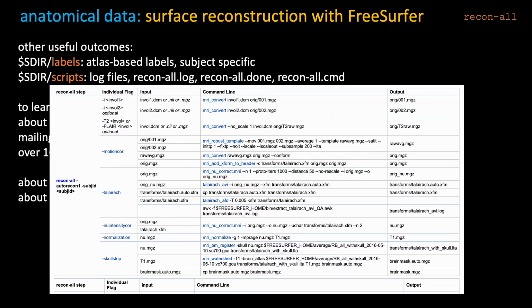So normally you would run recon-all with the all flag, and that is going to run the whole set of the commands. But if you want to run a specific part because either you're debugging something or you just generated a different segmentation, like we'll see in a few slides, and you don't want to replace this segmentation again by rerunning the segmentation part of FreeSurfer, this is a way to run recon step by step. You can also skip some steps if this is something that you either don't need or you have replaced with a different strategy for that part. That's also possible.